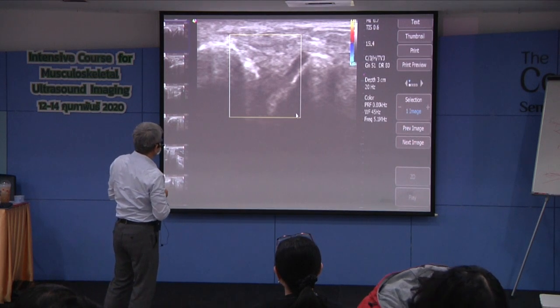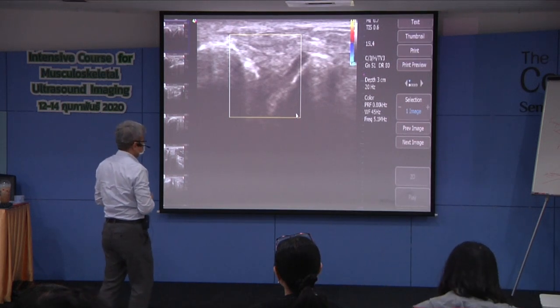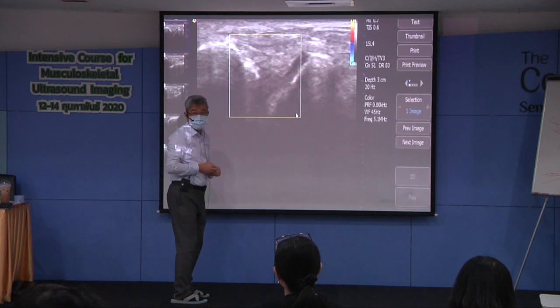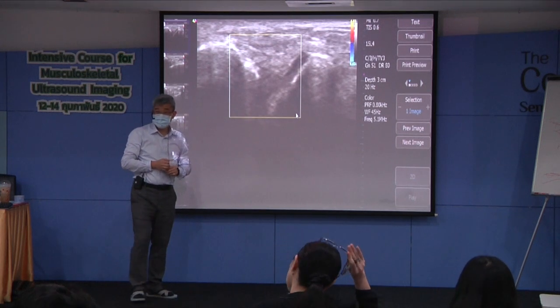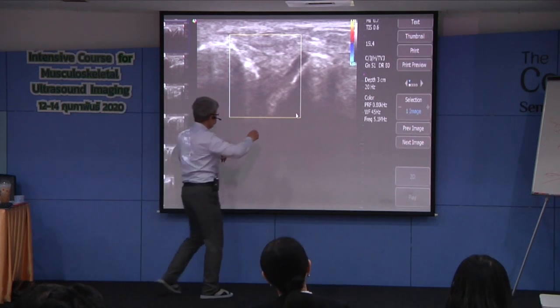Right. I will tell you what you found in this imaging. This is the imaging of ATFL. Is it good? ATFL is here.